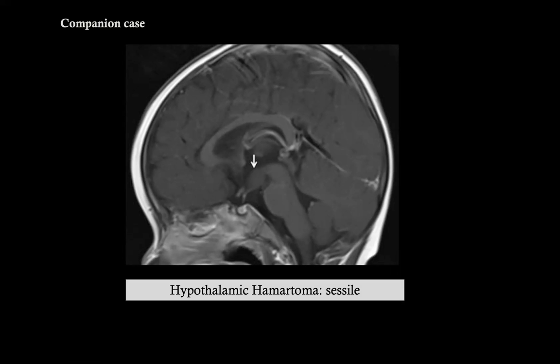I will not go into details, but what I suggest is just have a look at the ear, because most of the time it is normal, but when you see this enlarged internal auditory canal with this corkscrew appearance, and frank hamartoma or slightly dysmorphic hypothalamus, even without seizure, this is a diagnostic combination.